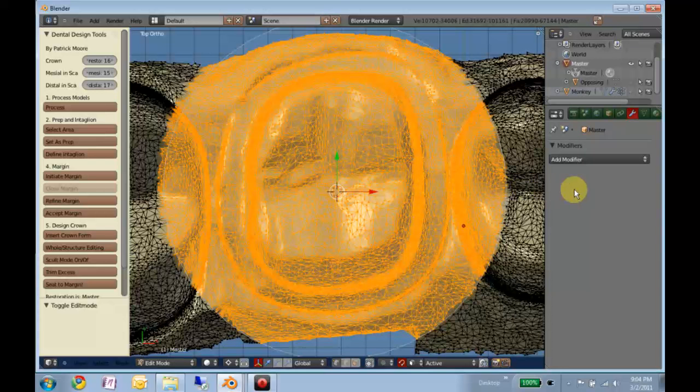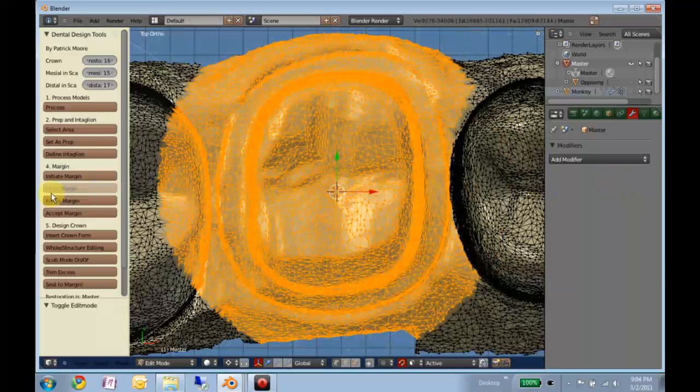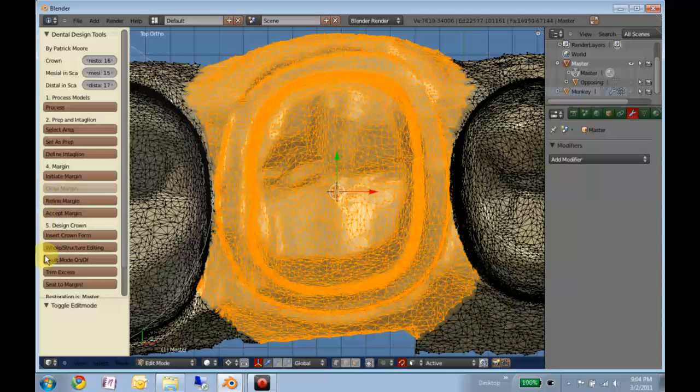And then if you use the middle mouse button, it will deselect. So I find that this is kind of the easiest way. It's usually just 3 clicks, maybe 4 or 5 to kind of clean it up. That's one way of doing it.